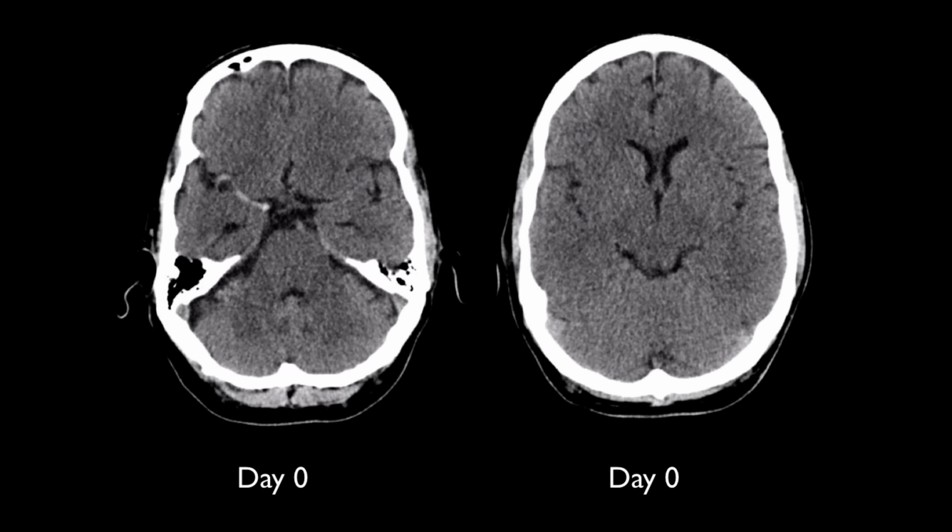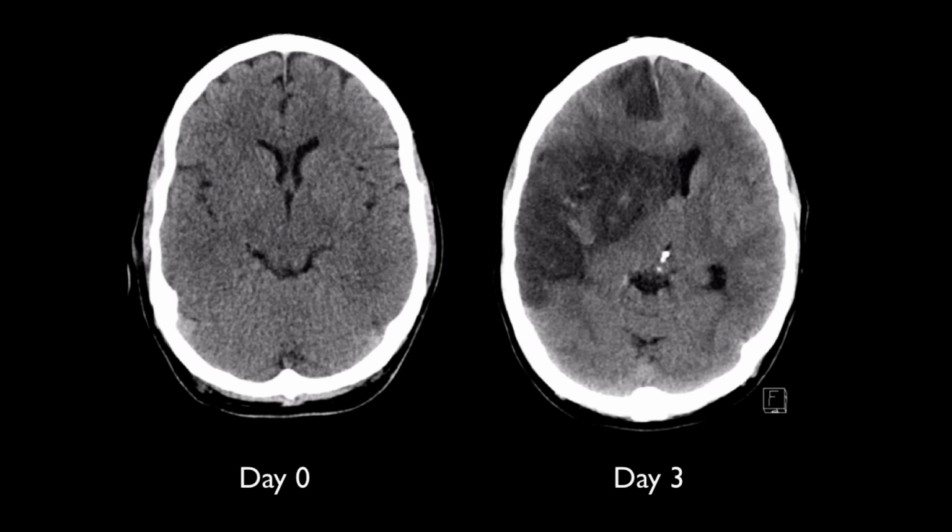Going back to our previous patient, over the next couple of days the infarct becomes easily visible as a region of well-demarcated low attenuation, in this case with some areas of small hemorrhagic transformation. This is associated with swelling as extracellular and intracellular fluid accumulates. This is due to cellular swelling and breakdown of the blood-brain barrier. There is corresponding positive mass effect. Maximal swelling occurs during the first week, typically maximal at day 3 or so.